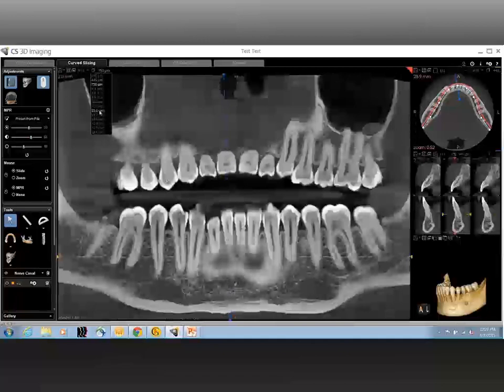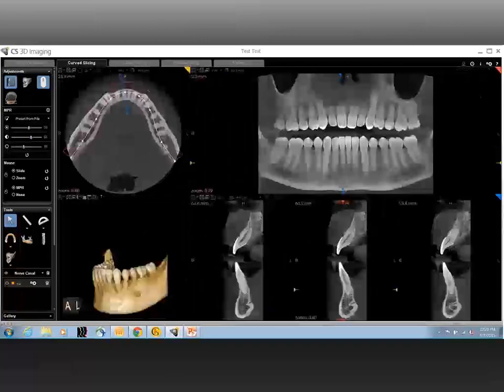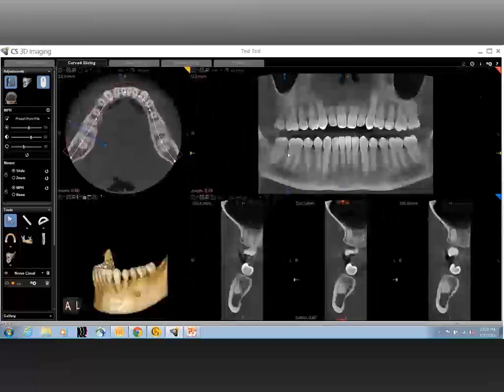That is a very good question, Jordan. Your question actually leads to one of the most important things, that when we analyze any kind of anatomy, it may not be just limited to the critical structures. There might be a few other things that can potentially give you an idea about how the surgery has to move.